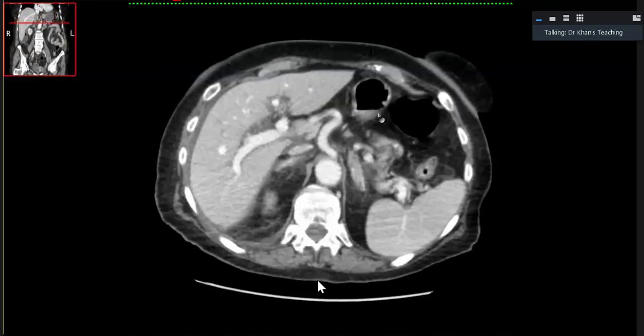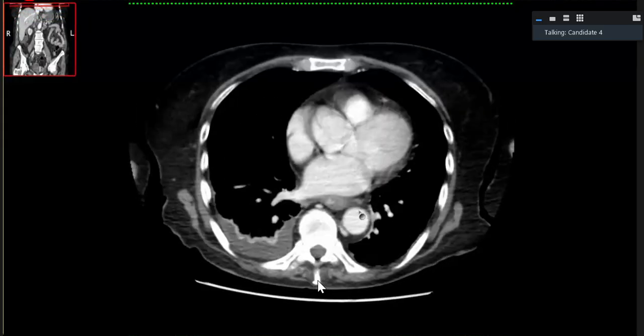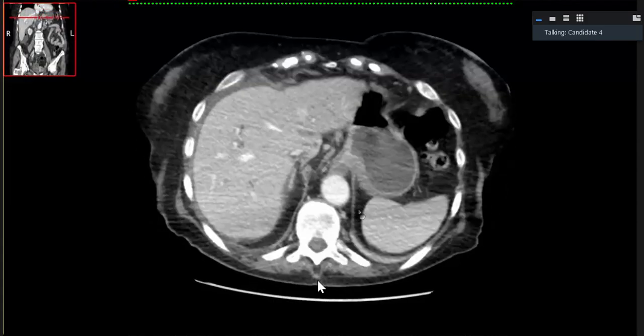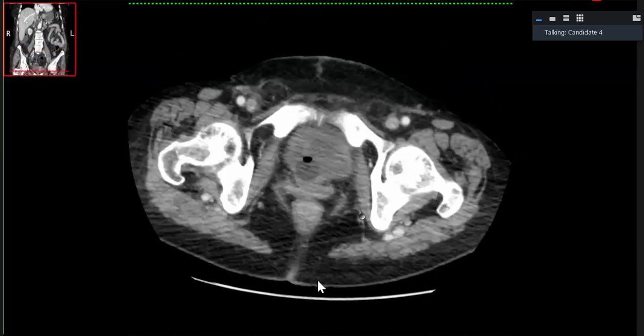So this patient is an 84-year-old, came to A&E, classical acute abdomen, very tender, things like that. And over to you. Okay, I am presented with the CT abdomen, portovenous phase. This is a patient which came through A&E with acute abdomen. First, I will scroll through the whole stack of images. Then I will start commenting on my findings.